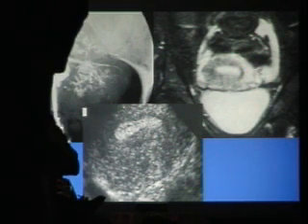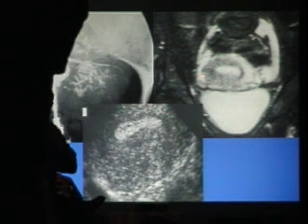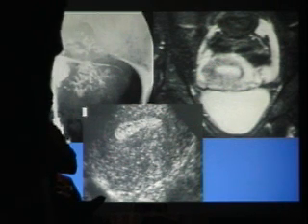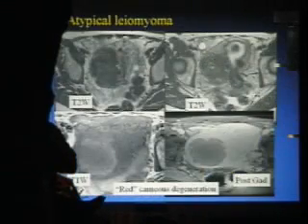That junctional zone is the basal layer of the myometrium. So it's the first layer to be penetrated by these burrowing endometrial tracts. And so what happens is that the junctional zone thickens right up, and you get these punctate little dots of high T2 signal tissue out in the myometrium. And that's your classic appearance of adenomyosis on MR.